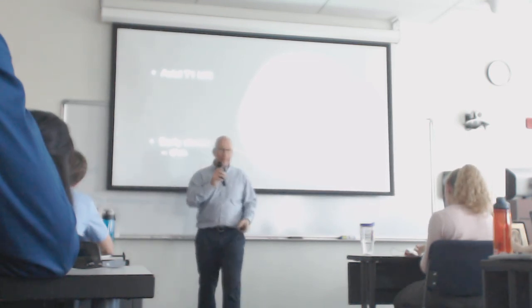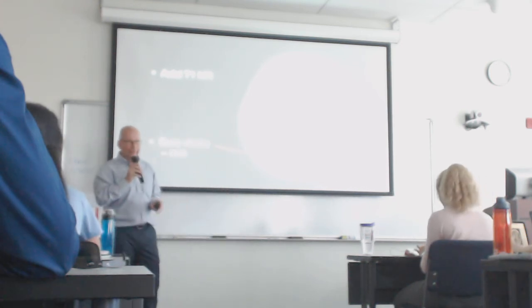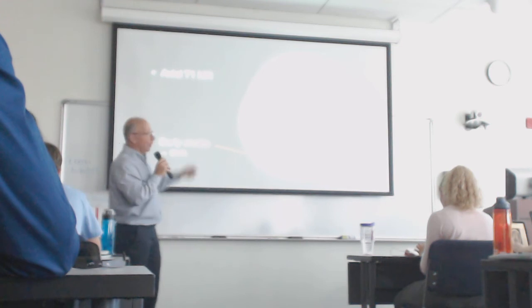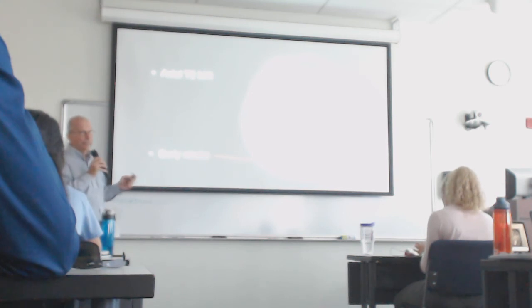Well, early hemorrhage on MR, when it does appear in the parenchyma, is white. You don't have to remember it. I'm not going to ask you. But that's why on the T1 weighted image, that's white. But that's not really where you're going to see those strokes.